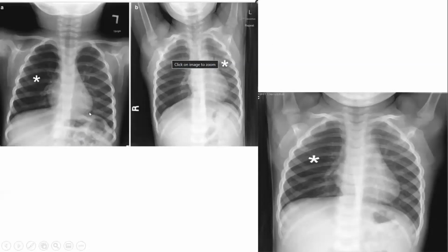So just to illustrate, this is a chest X-ray. The first X-ray shows slightly hyperlucent right lung. Because you're not sure, we have done a left decubitus or the left side down. When the left side is down, you can see the air has gone out, so the lung has reduced in volume. For the same child, you put the right side down, that lung, because there is air trapping, the volume has not reduced. So it indicates that there's air trapping in the right lung. It just shows you that there is air trapping, but it doesn't show foreign body. So you have to go ahead and do a CT.